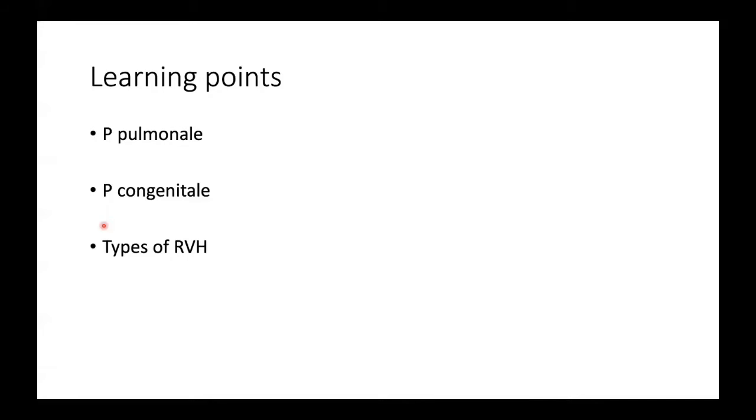How? If the height of the R wave is more than 15 mm, or if the R dash is more than 15 mm, or sometimes we say 11 mm, it is called type 2. You see this in conditions like ASD, patients with ASD. And type 3 RVH you see in patients with COPD. They do not have a classical RVH strain pattern, but they have a different morphology because of the RVH, because of the emphysema. There is an anatomical shift in the axis. So that is the third type of RVH. We'll see it in the further slides.